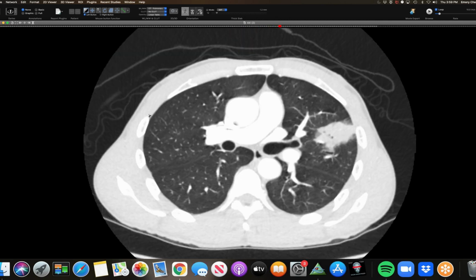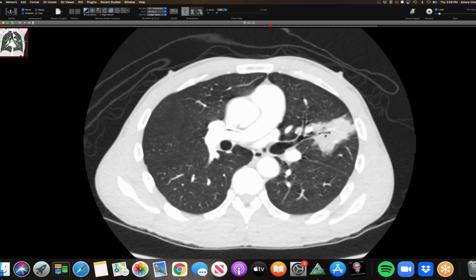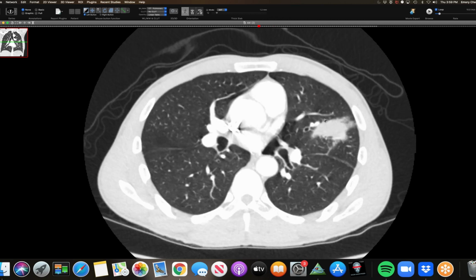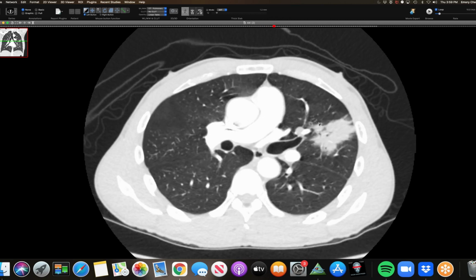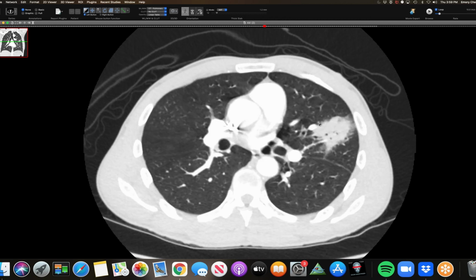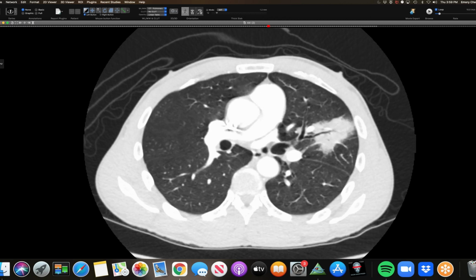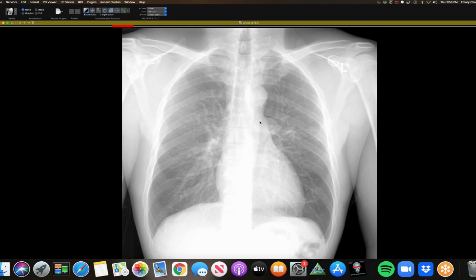Is this pattern usually this segmental type? I was going to look through some of your cases that you've shown. Yeah, that's a pretty typical appearance. When you showed it and it wasn't a cancer, that's when I figured it was going to be blasto. It has that look. Sometimes it's larger and cavitary, but yeah, that's a nice case.